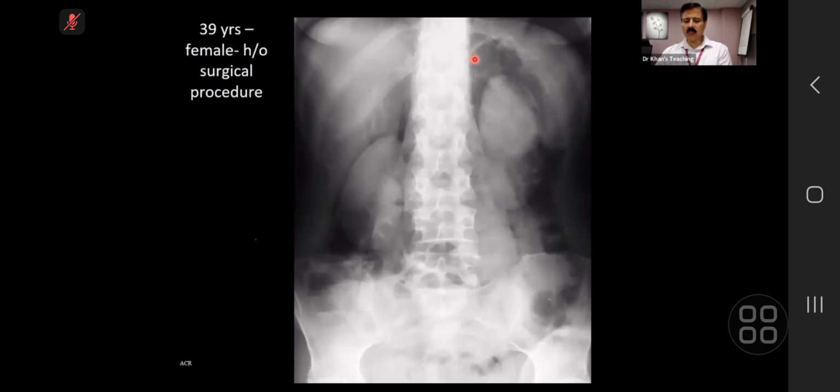Another sign, which now if you pick it up in your exam as a retroperitoneal gas, of course you pass, but you want to get more and more marks, and the finer touch is that you have to pick up the findings. Another beautiful sign is this one, which we call the large bowel Rigler sign. If you go back to your anatomy, remember that a portion of the ascending colon and a portion of the descending colon is in the retroperitoneum, right?